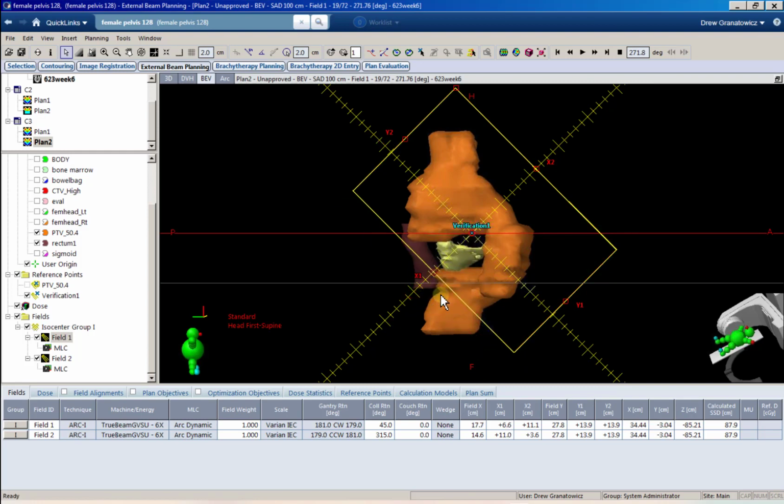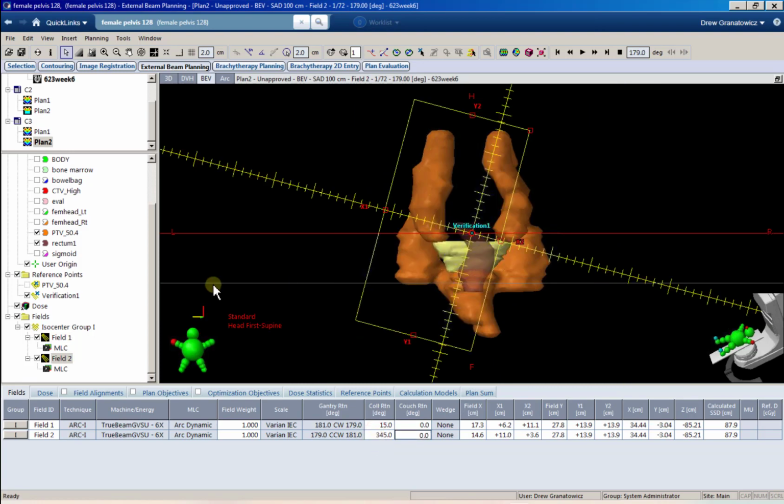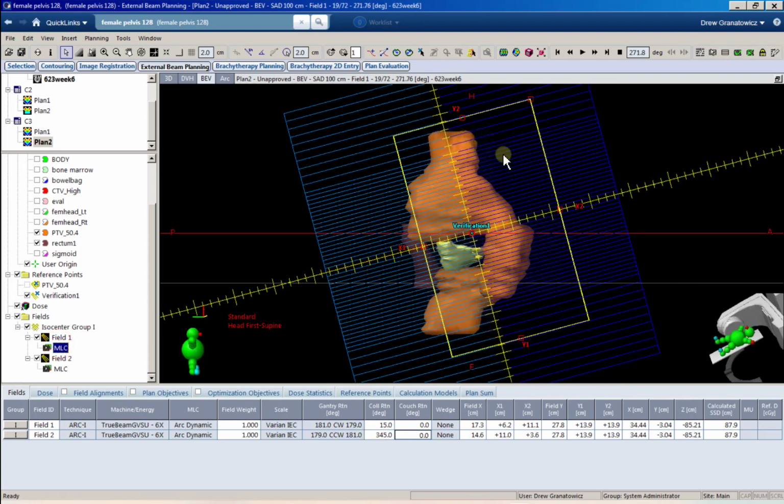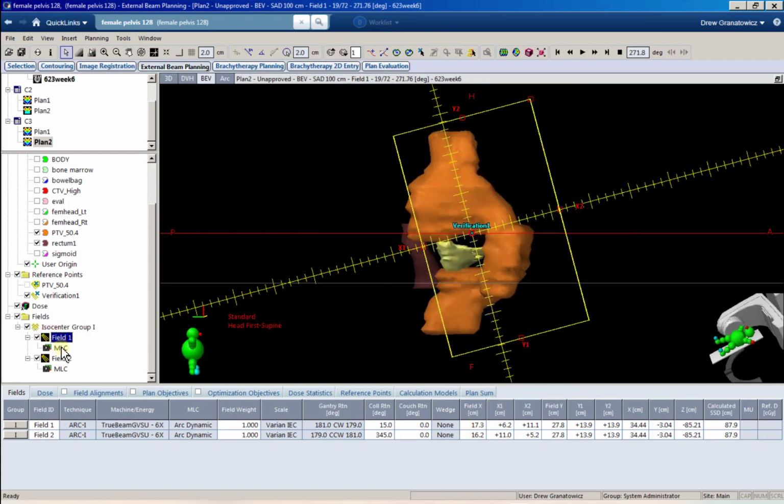You'll notice right away once you start optimizing because you won't have coverage down there. But I just wanted to point that out to you. All right. Field 1, drag X1 down over. Field 2, drag X2 over. Make that a little wider, 16.2.